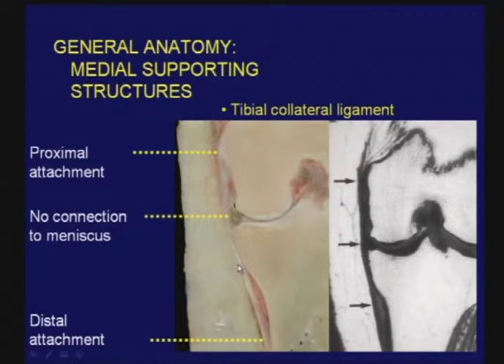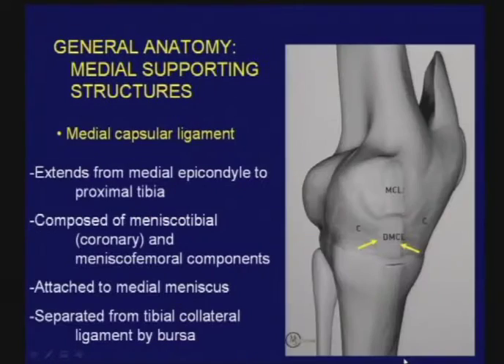Recent anatomic descriptions, however, have suggested there is a proximal attachment of the tibial collateral ligament, but most of us still consider the main attachment to be way below the joint line, with genicular vessels located between the ligament and the surface of the bone. Typically, we see the outline of this ligament very well because there is clean fat just exterior to it.